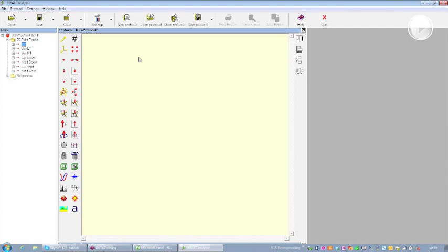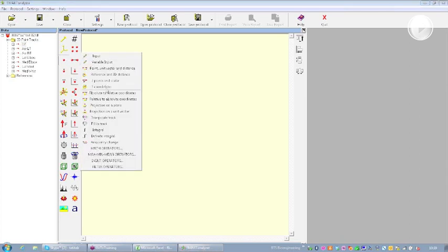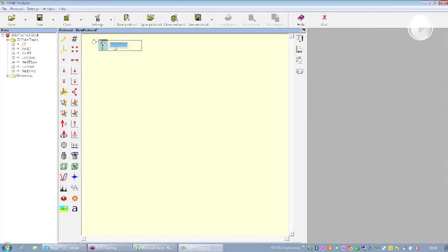So we select the 3D point tools, operators, and we look for this operator, interpolate track, interpolation of an object using a cubic spline, because basically we interpolate a track using another function that is going to follow the track and fulfill any lack of information. This is the tool that we are going to use, and we start by drag and drop markers from the left side to the right one.